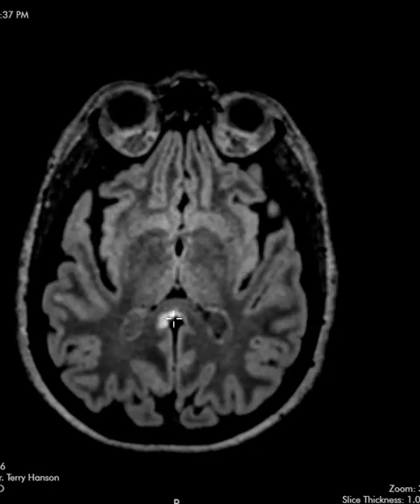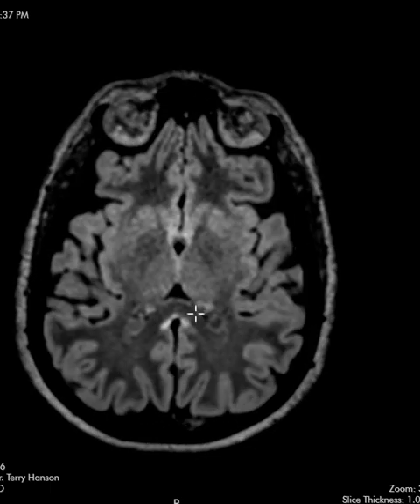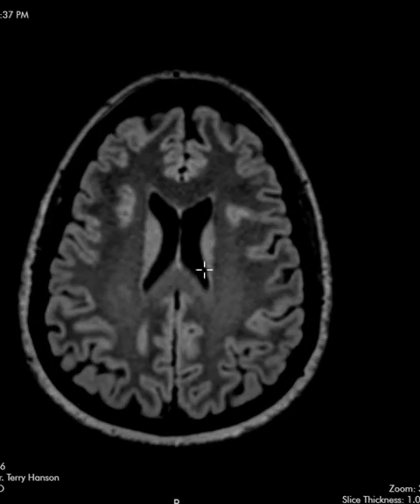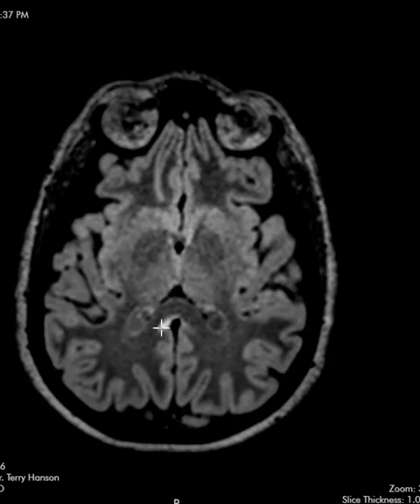It's affecting the posterior corpus callosum. And we also look around the ventricles to see is there anything hugging the ventricles right in this area, those Dawson's fingers, and we don't see anything else over here. But again, that signal back here, really classic for MS.